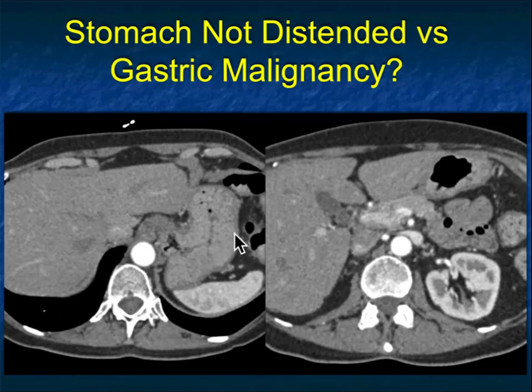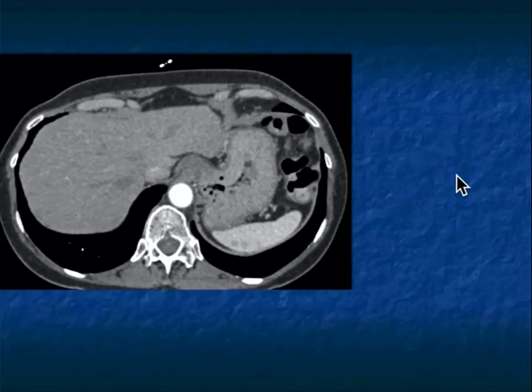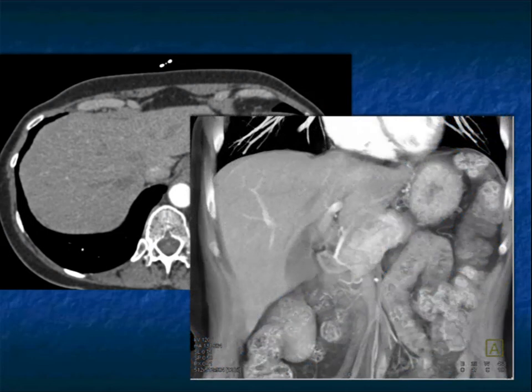But then you look at this case. What do you say here? Is this infiltration? Is this lymphoma? Is it carcinoma? Or is it lack of distension? What is your report going to say? Unopacified stomach, can't tell, or you're going to overcall, undercall, advise clinical correlation, you're going to ask them to repeat the study. None of that makes any sense.